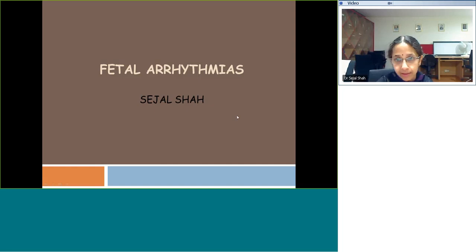Good morning, everybody. Today we are going to see the assessment of the fetal rhythm. This is in continuation with the previous lectures. What we saw initially was the indications of fetal echo, then we went through the basics of how to do a fetal echo. After that, in the last session we saw the Dopplers in fetal echo. So this is a continuation of that, where we are going to try to understand the rhythm in fetal echo. This is going to be a very basic understanding with a little touch on arrhythmias.